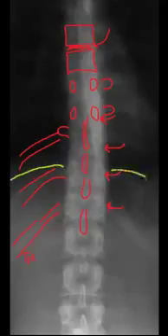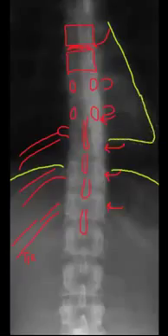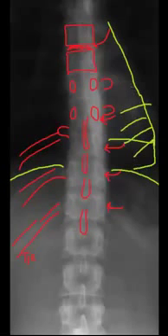You can also see varying amounts of the diaphragm. In this case, let me just grab a different color. Here's the diaphragm. Here's a portion of it, or a hemidiaphragm. Here's the other portion of the hemidiaphragm. And here's the heart shadow. Now, as we all know, there's a lot more soft tissue that is normally visualized. However, this thoracic spine film was collimated pretty well. I'm just filling in the rest of the heart here, which you can see part of the density of.